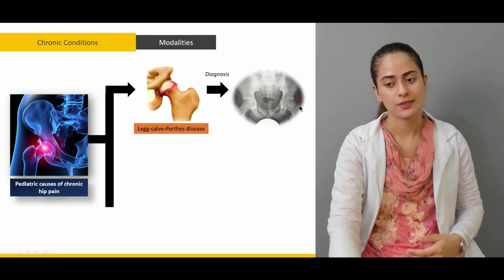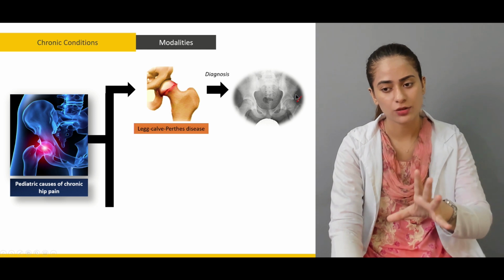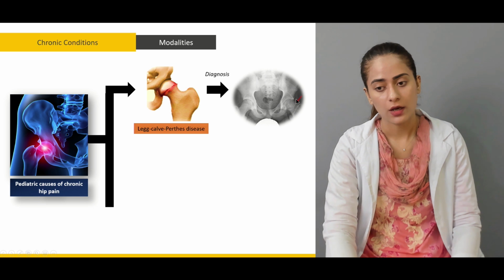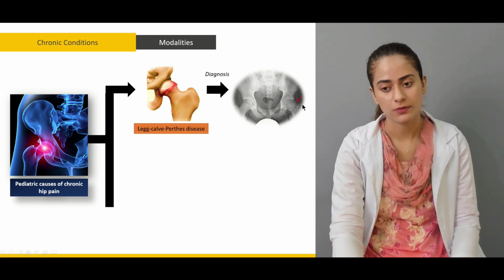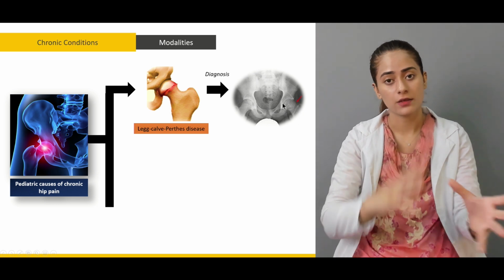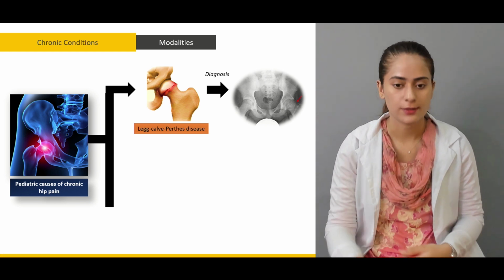So if this is a kid, this is actually the capital epiphysis here and an epiphysis here as well. So this here is not completely necrosed, but is necrosing, in the process of dying. If you have a kid who presents like this, ignore this, it is because of the bladder. So again, if a kid presents with something like this, comparison will help you suspect Legg-Calvé-Perthes disease.